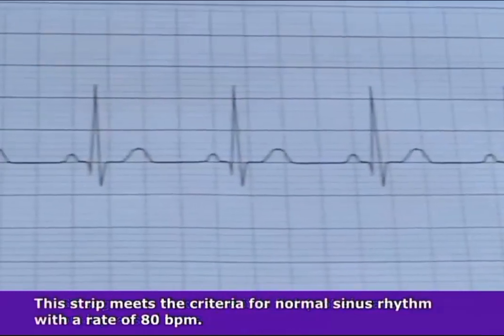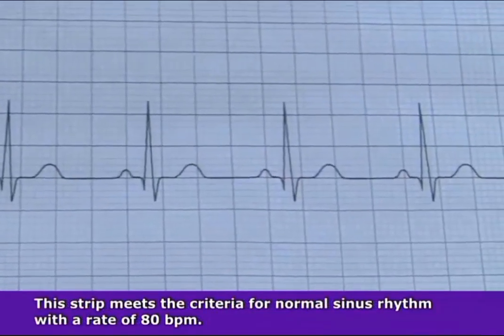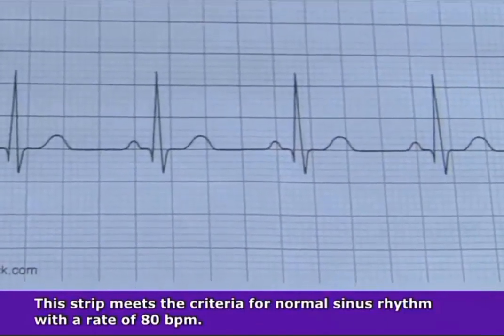So with all those questions that we just answered, whenever we look at this rhythm, it meets all the criteria for normal sinus rhythm with a rate of 80 beats per minute.